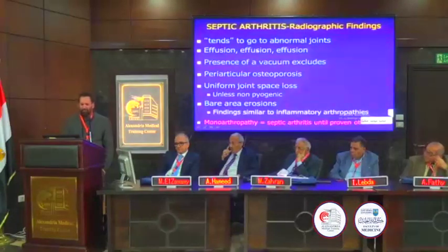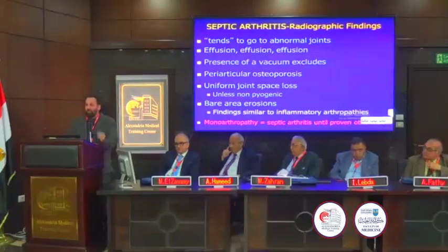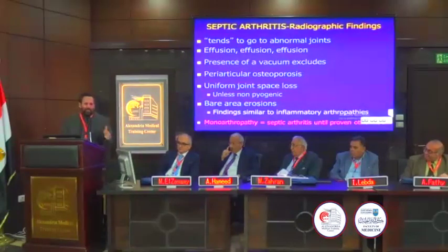This is another case, pyomyositis. This was a diabetic with a tibialis anterior. Pyomyositis, non-compartmental, diabetics, or patients, poorly controlled diabetics, I should say, or patients on chemotherapy. So we did skin, subcutaneous tissue, fascia, and muscle, and now let's do joints.